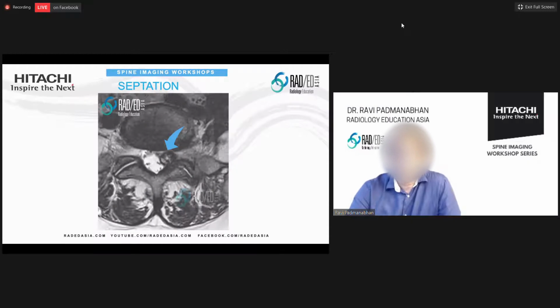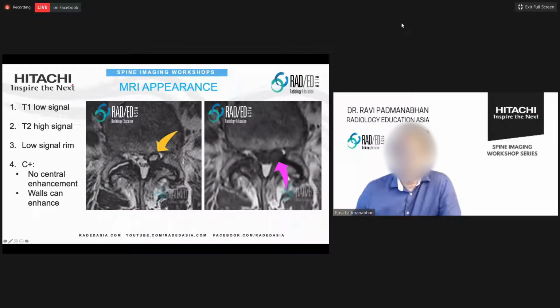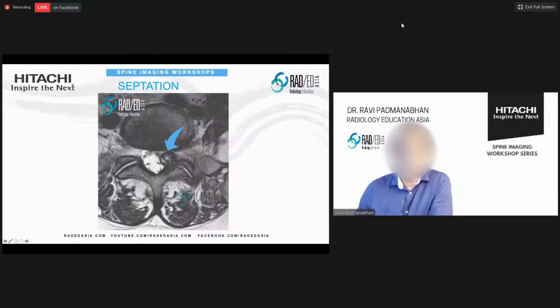Some variations in it, so they can be septated. If I go back here, this one doesn't really look septated. There's a bit of heterogeneity in its signal, which is normal. But if we look at this case, we've got septation within the cyst. Now, again, that can be found. It's not abnormal for the cyst. So this wouldn't be something where you'd say, oh, it's got septation, maybe it's tumor. Septation can be seen with cysts.